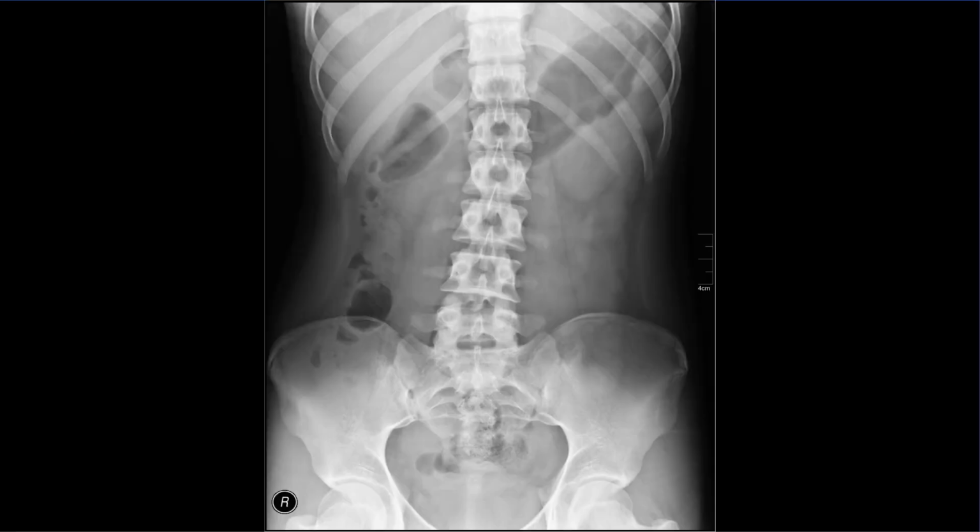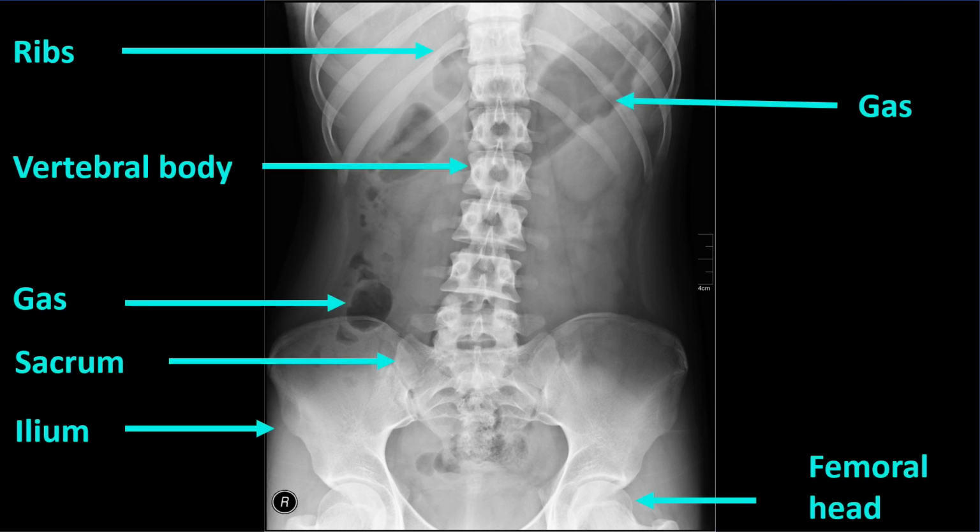This is an abdominal X-ray. As with the knee one we saw previously, abdominal X-rays are not constrained to one plane, so we are seeing everything in the abdomen. The bright structures are bones, but we can barely make out any soft tissue organs.